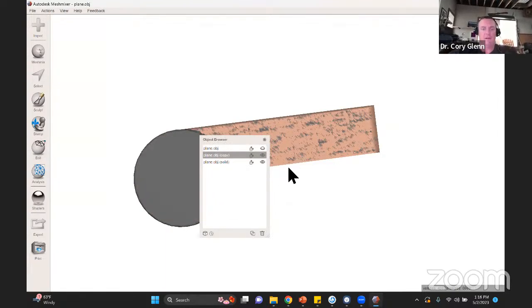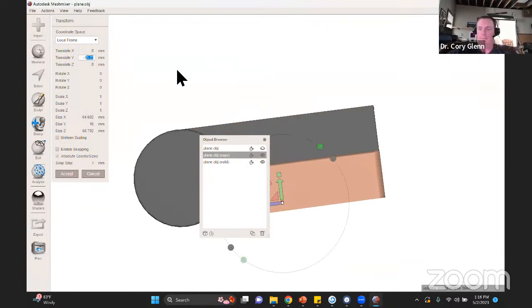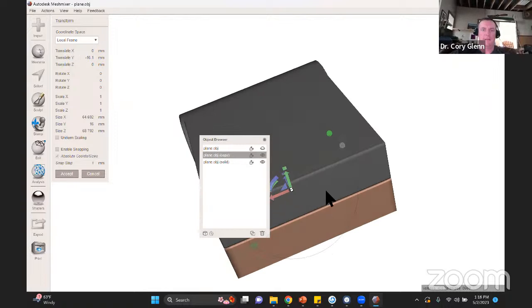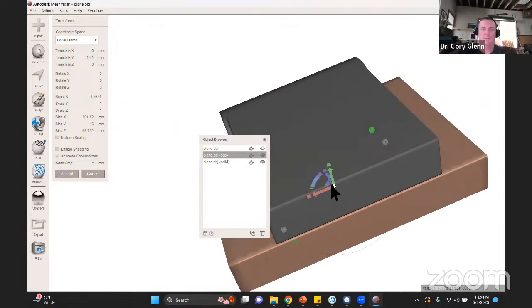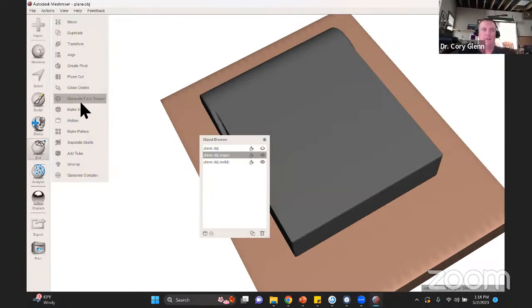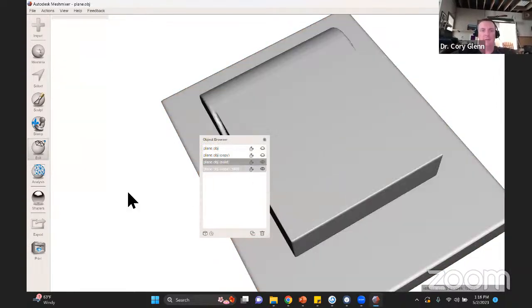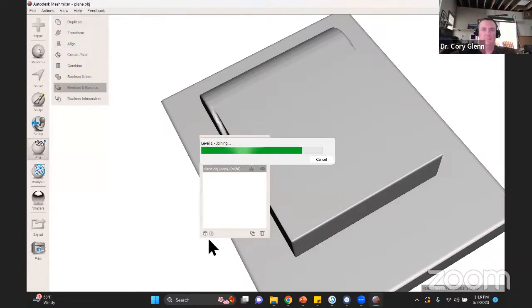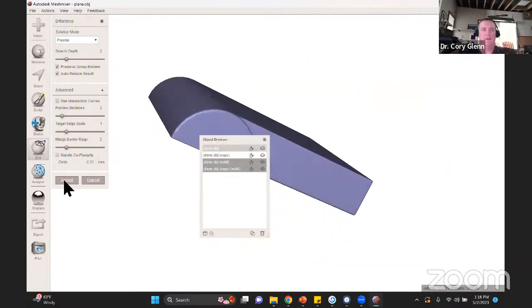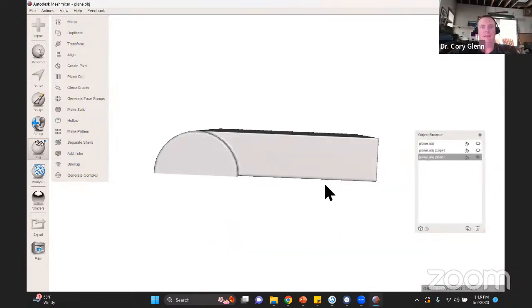And if I just wanted to make it all look pretty, I could bring this down. And I could stretch it a little bit further. And then I'll just Boolean subtract that. So now I could take this shape, subtract that shape. And now you have a homemade plane of reduction that you could bring into any case.